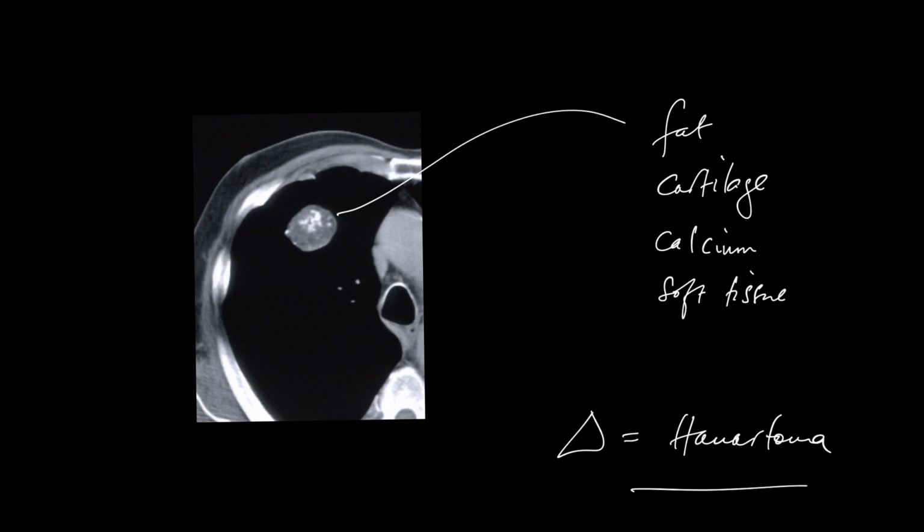Don't forget that hamartomas are still allowed to grow, they're just not allowed to grow excessively. So they can mimic neoplasms, but when you detect fat, you can be sure that if you have other constituents, you're dealing with a hamartoma.